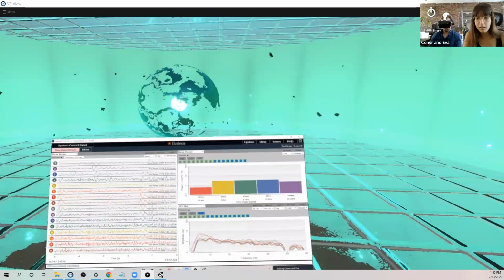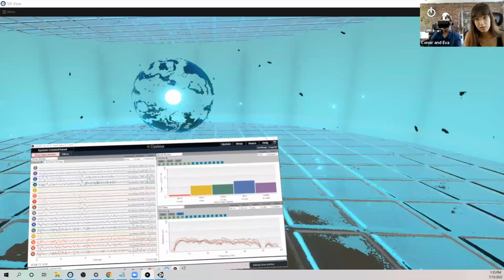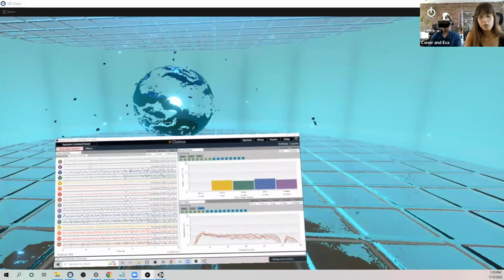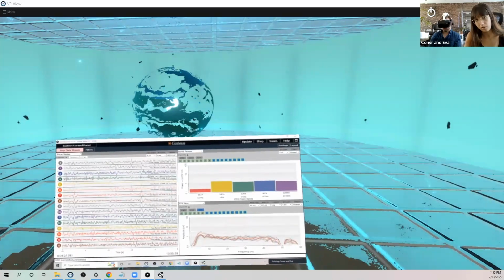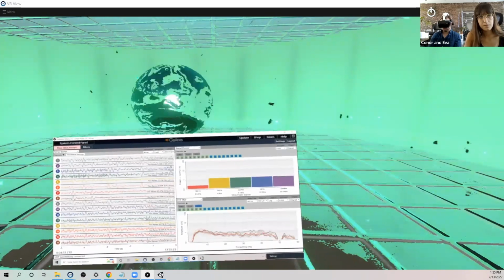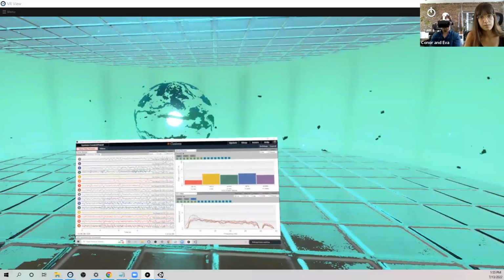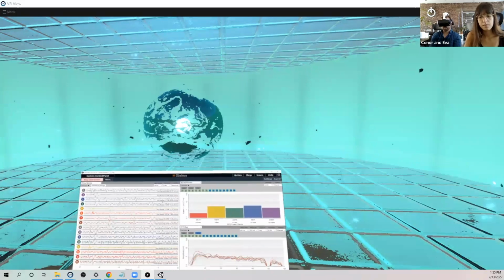Can you guys see the glowing sphere and the GUI that Conor is holding? Yes. Okay, so you can see what he's seeing. He basically sees the room, but also the GUI, so that we can show you how the colors are mapped, and you can see both the raw data and also the game experience. So right now I'm gonna close my eyes and produce alpha, and you should see it in the GUI data, and the room should also turn green.